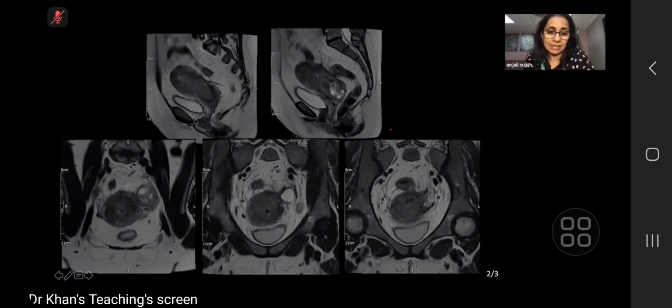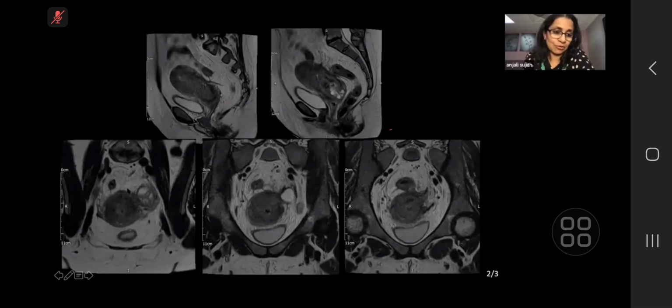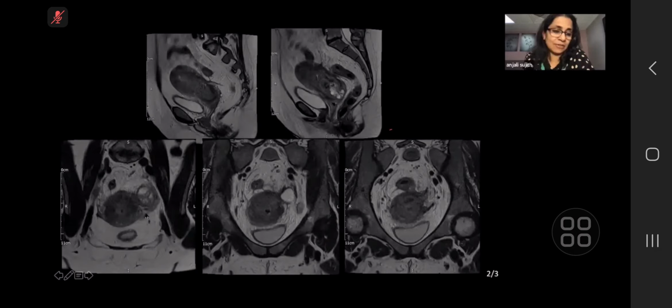Good. And what am I pointing at? A lymph node? There's an enlarged lymph node there. And what is happening to the left adnexa? I think in the left adnexa, is that involving the left ovary within the mass? It looks like it is extending to infiltrate into the left adnexa.